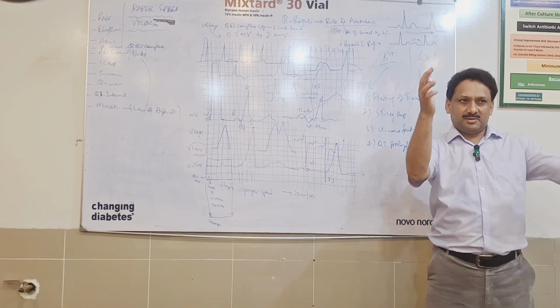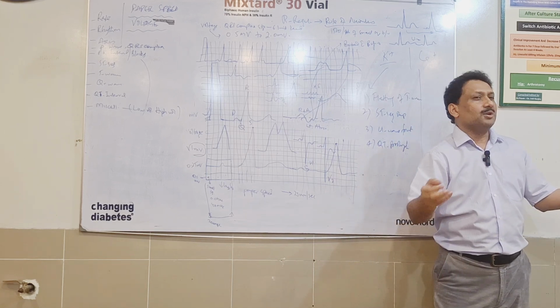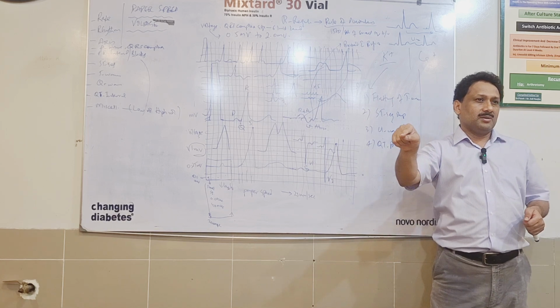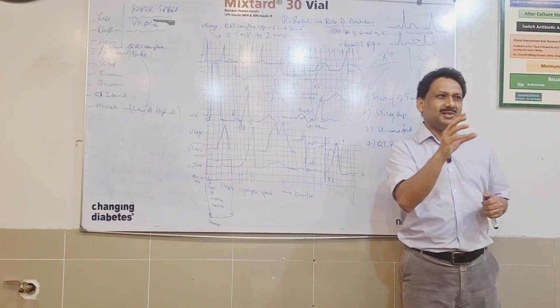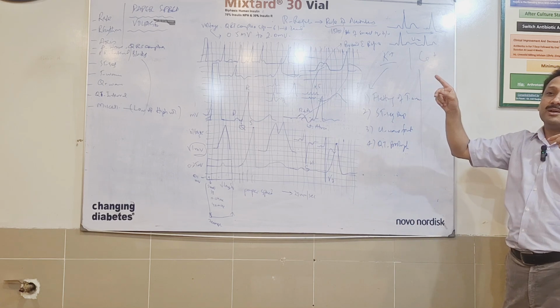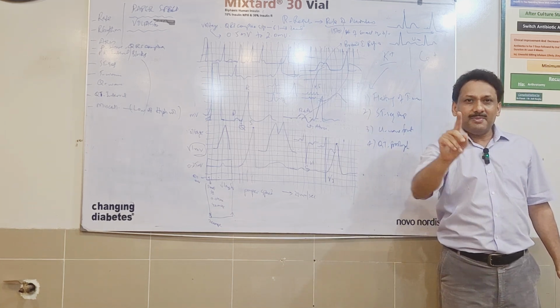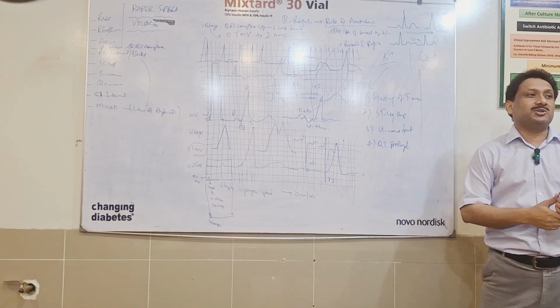Now, this is your task. Just go through the literature. It's not necessarily only hypokalemia, but at least you should know that in hypokalemia, if U waves are there, the potassium is quite low. It is usually lower than 2. So the potassium levels are very classically guided by the ECG changes. So U wave is another T wave with the same direction. Remember, there can be rare inverted U waves. Those are in a few other things, not necessarily supposed to be mentioned here.